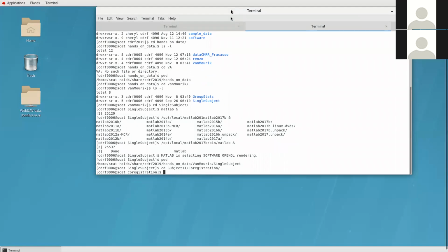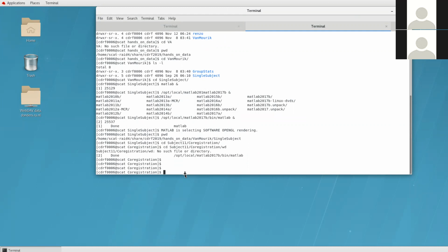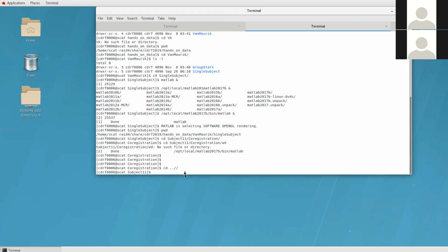So let's see, where am I now? Right, I'm in one folder above. And the reason that I shared subject 11 with you is that that is my brain.